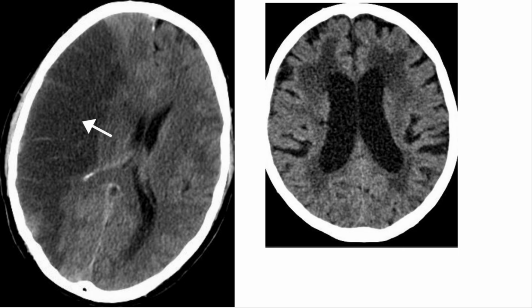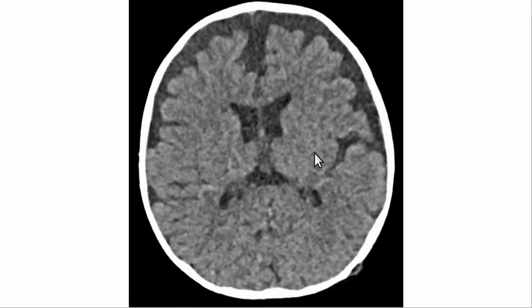But on the next slide I'll show you what I see most often. This is what I usually see. Typical patient: memory loss, cognitive impairment, dementia. All this is cerebrospinal fluid anteriorly, and in the interhemispheric fissure here, it's isodense with this intraventricular cerebrospinal fluid, CSF. And the point I'm making is an atrophic, shrunken brain is the most common thing seen on CAT scan of the brain when looking for a cause of dementia.